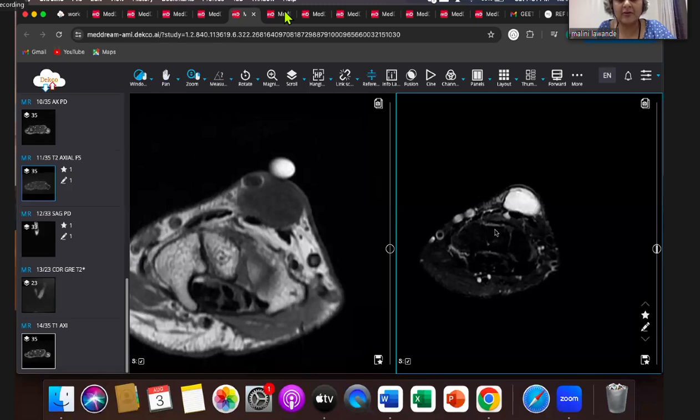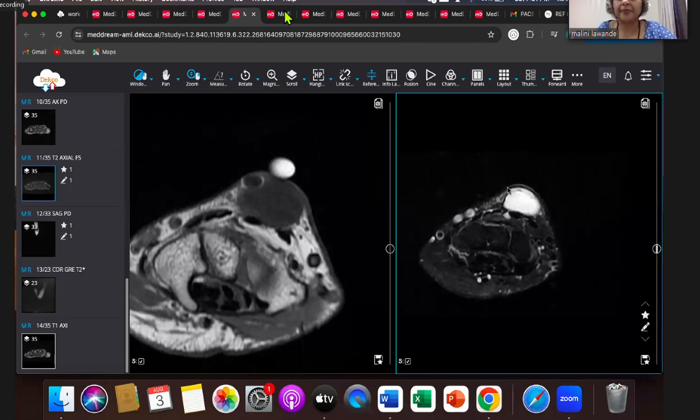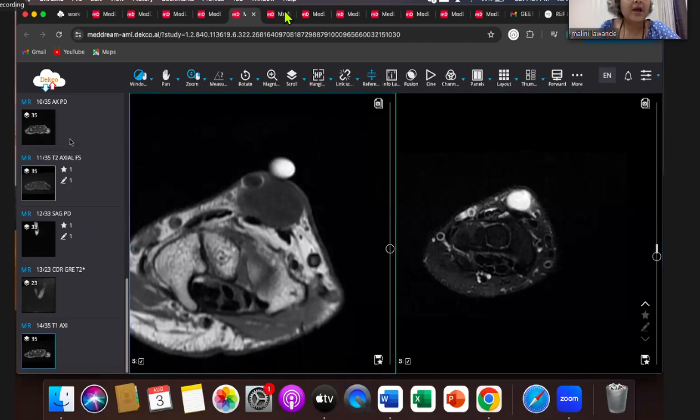This ganglion, maybe you can put in the chat. Periarticular, which joint? Peritendons. Yeah, so this is the typical dorsal scapholunate interval. This is the most common location for a ganglion cyst in the wrist. Here you can see the whole ganglion has come out subcutaneously, but when I look carefully, I can see a small extension going up to the dorsal scapholunate interval.